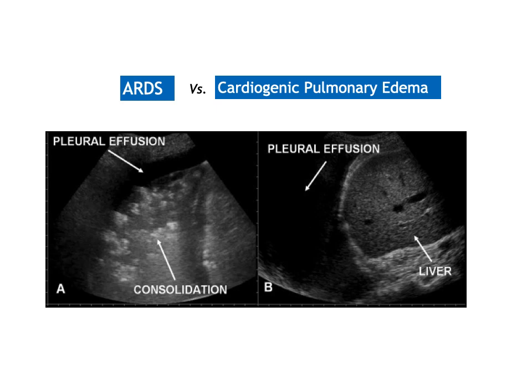But otherwise, most of the SARS-CoV-2 infection patients with respiratory failure develop a moderate degree of loss of aeration, which happens in the form of patchy B lines, as we will describe in the next slides. But we don't usually see lobar consolidation unless there is an ARDS typical picture or secondary bacterial infection.